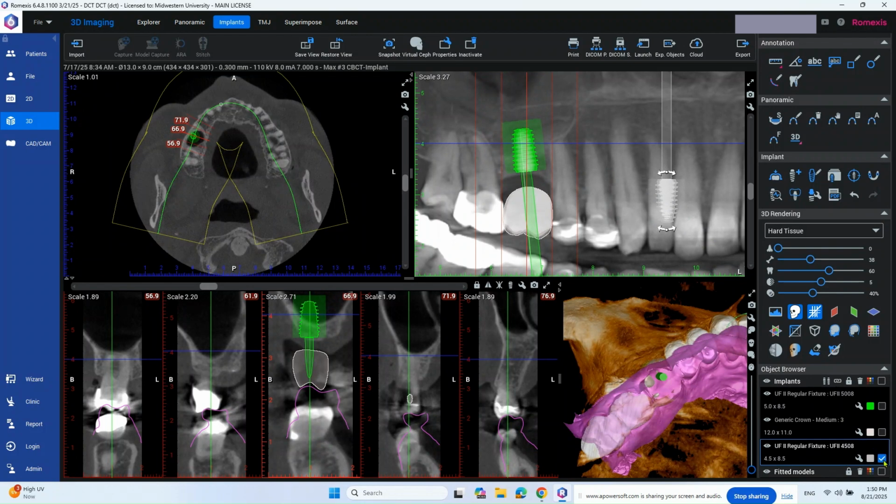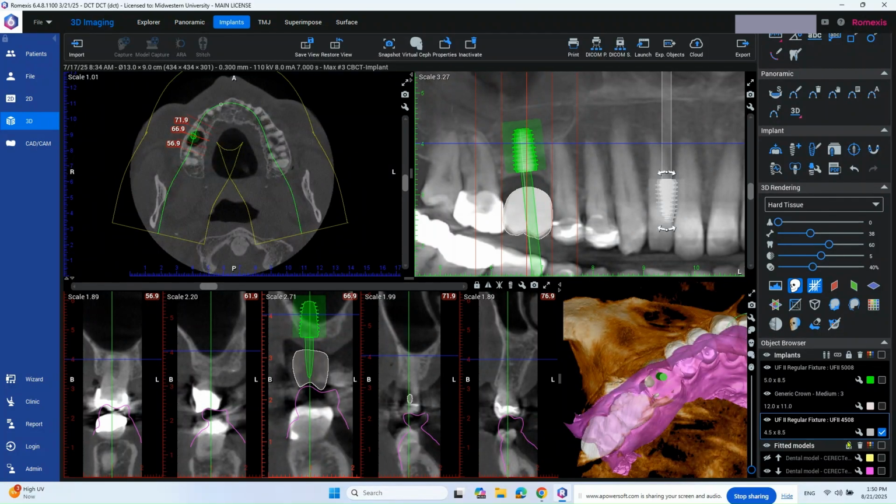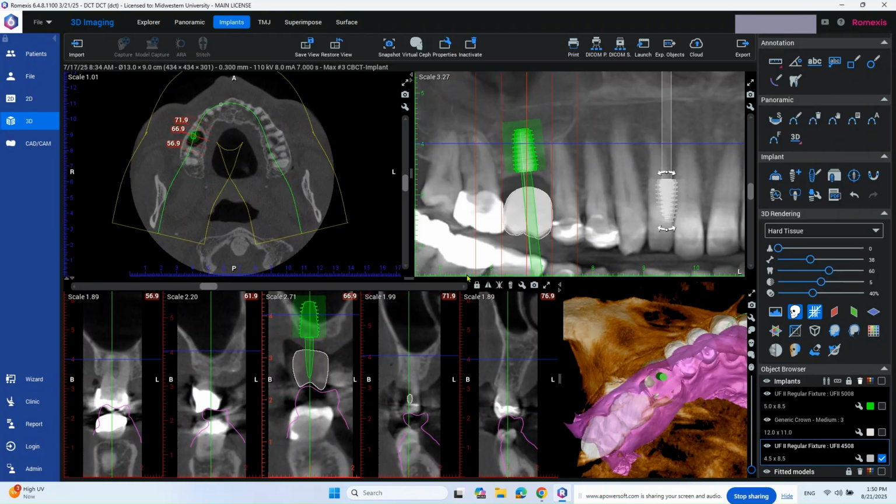To delete something, you're going to highlight it and look for the garbage can. But just so you know, each browser group has its own garbage can. So you can't click this, hit this garbage can, and delete. I'm going to hit this one, and then I'll come to this garbage can. I'll just confirm delete, and it'll go away.